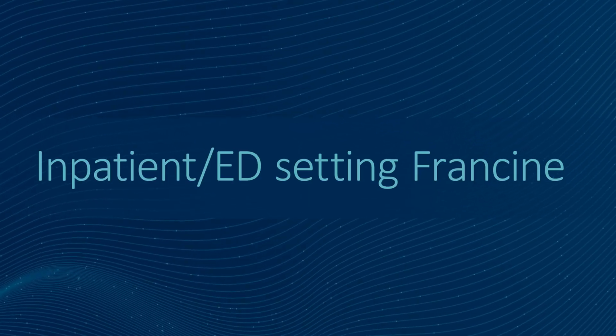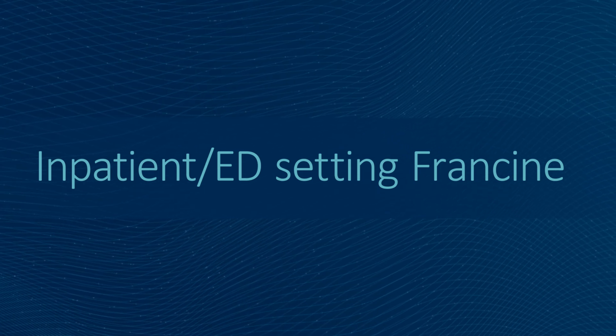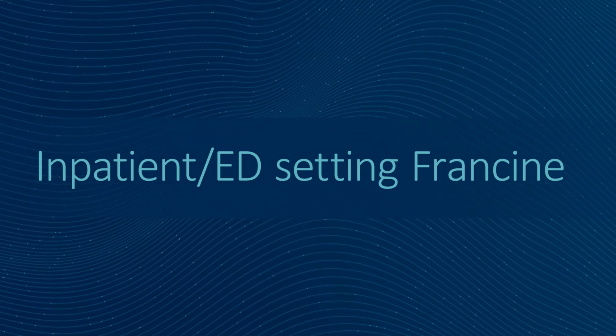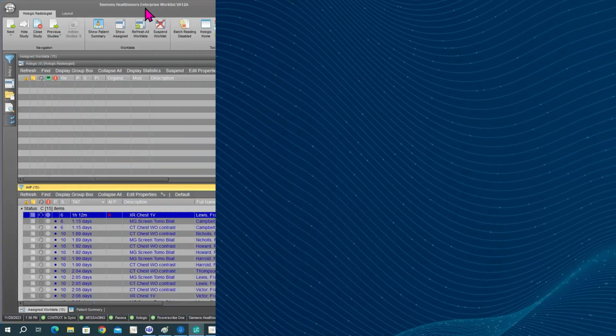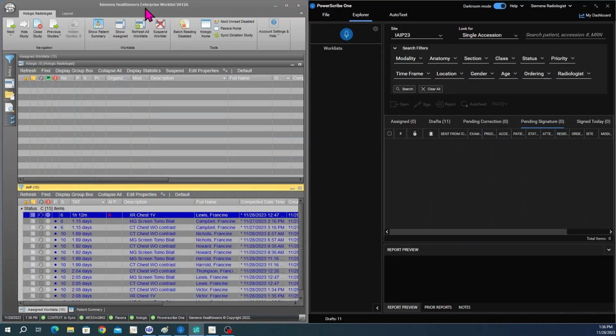Today we'll walk through the clinical scenario of a patient, Francine, a 47-year-old female, who comes into the ED for shortness of breath. All of you should recognize that this is a PACS system. The demo will focus on this system with which we are used to working every single day. In this case, we're focusing on the Paxera PACS system.